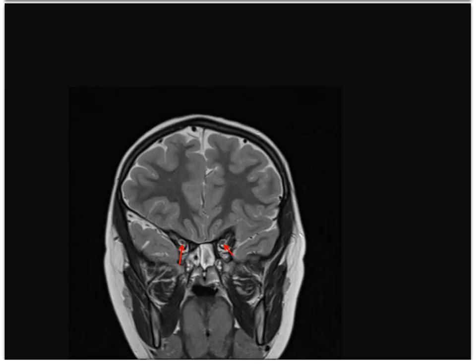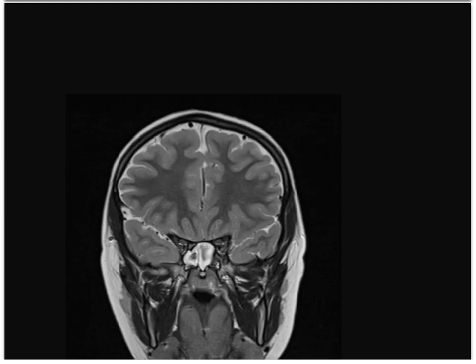Optic nerves are well seen surrounded by cerebrospinal fluid in the posterior orbital apex. Sphenoid sinus air cell, which normally contains air and would be black, has mucosal thickening. On this slice, we can see the frontal and temporal lobes are separated by the lateral or sylvian fissure or sulcus, outlined here in red.